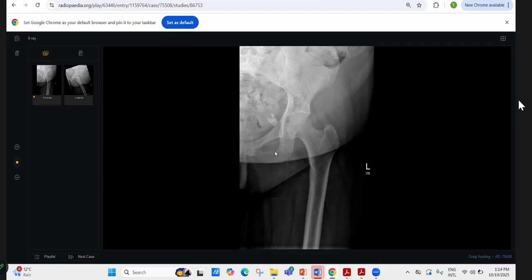So if the patient came with on and off pain in the left hemipelvis, so they did X-ray, you find a tooth-like opacity straight away. And for candidate 3, the joint is fine. There's no problem with the sclerosis or anything. I did not stop you when you were explaining, because there are examiners who will not help you in the films, and there are some examiners who will definitely help you. It's personal, just to give you the idea that they will not say anything, and they will let you go where you are going in that film. So this is dermoid, and you will refer the patient for ultrasound and gynecological assessment.